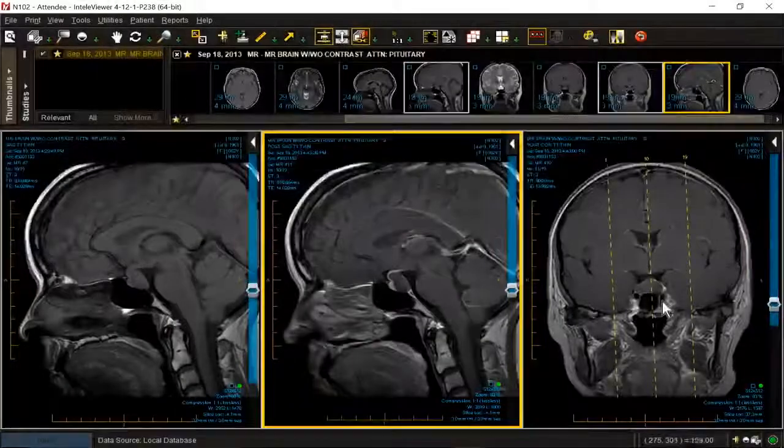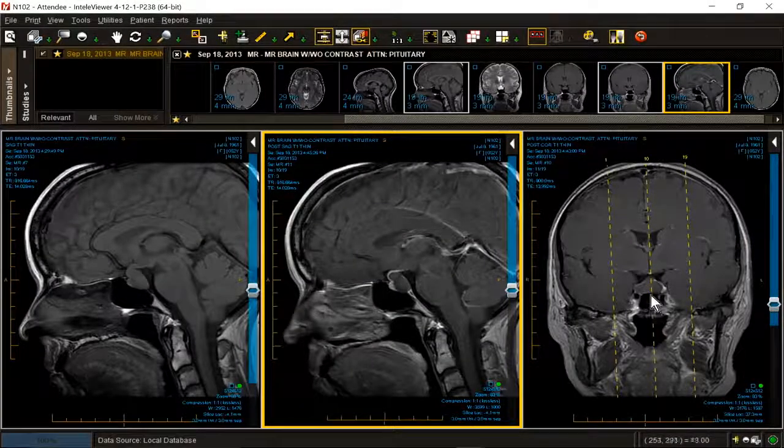These are often asymptomatic, but when they're big, they produce visual changes. And so they have to be sucked out from below. Let's see where our sphenoid sinus septum is. Hold on, let's go back for a minute. Our septum is over here. We have very easy access to our lesion from below, so we can suck it out of there. And again, when they're large, they have to be pulled out. When they're large, they can also produce diabetes insipidus and pituitary insufficiency.